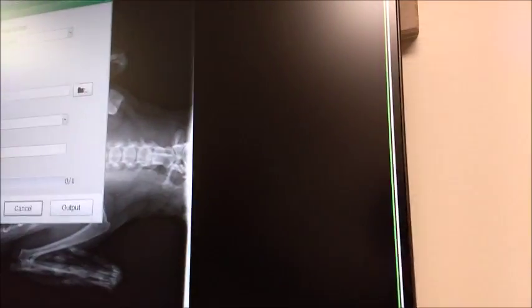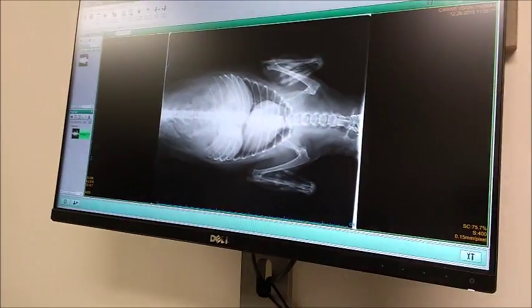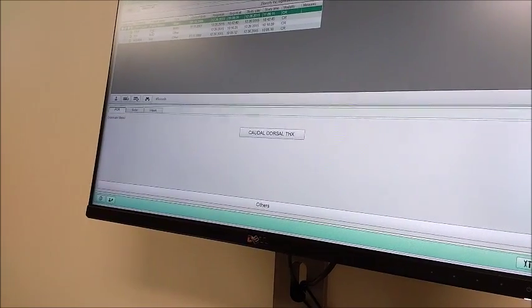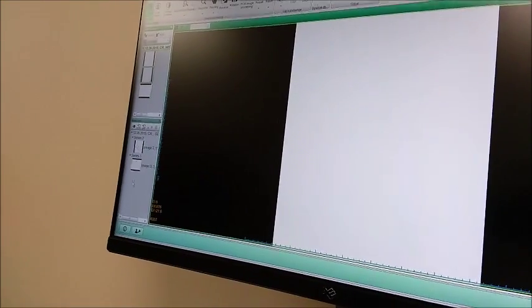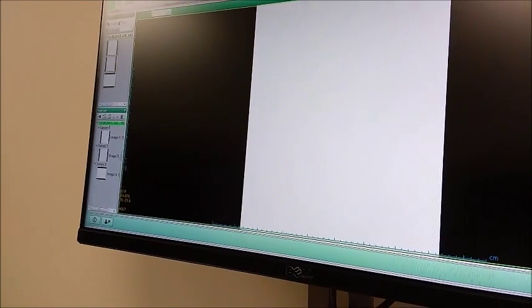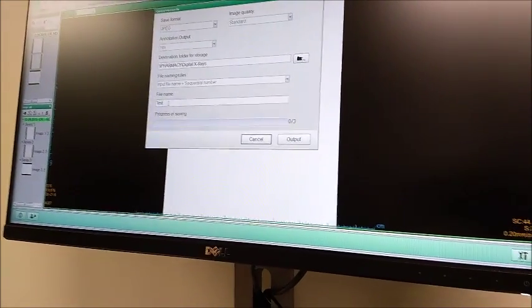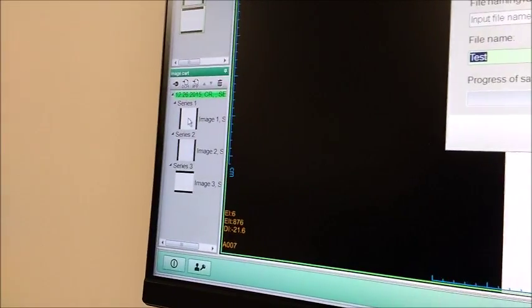Now, are you saying if there were a whole lot here, you should highlight all of them at once? No, let's see. One of these had a bunch in them. Is it this one? Yeah. So let's drag these all down. No, it's only going to let you highlight one at a time. Let's try it that way. Seems like I'm highlighting the whole header there. I don't know. That might send them all out. I'm not sure. We'll have to try it.